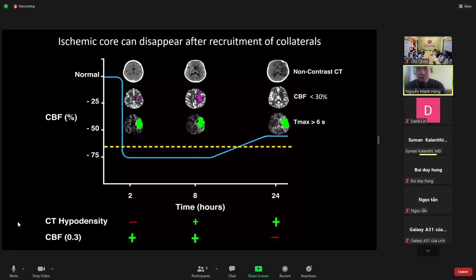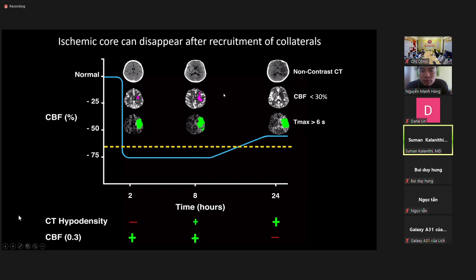Yeah. Okay. So always go with your non-contrast head CT. Sometimes it won't match, and that just has to do with different forms of blood flow changes that happen early or late in stroke. But you can always look at your non-con head CT, and that will tell you what you need to know. Any questions about that?